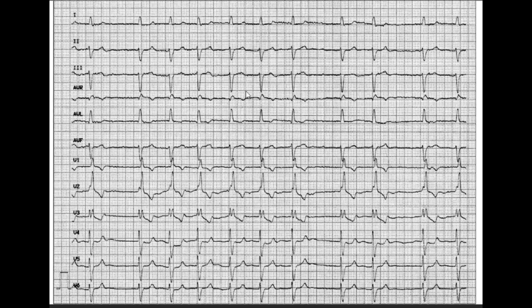And ST segment, I think there's depression in some of them, maybe here, but who knows? Usually when you see ST segment and T wave changes that don't follow a specific pattern, you say there's just a disorder of repolarization. So there are some changes with ST, even T waves.